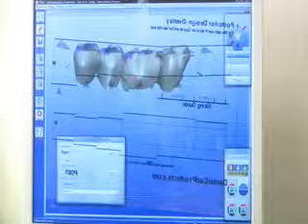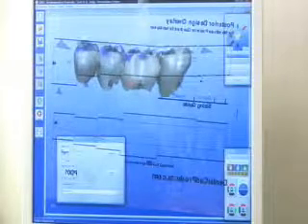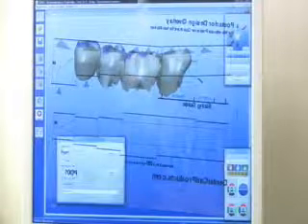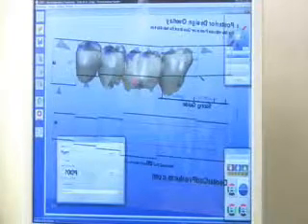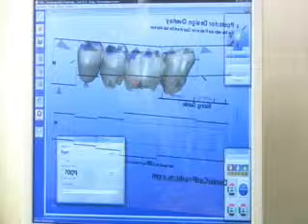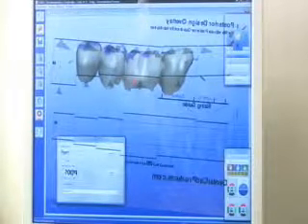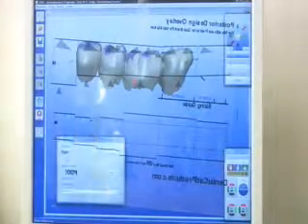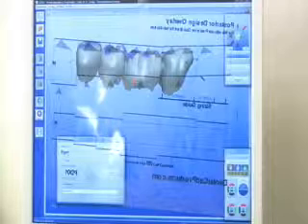The bridge function of the CEREC software is a great feature, allowing us to make provisional bridges. You couple this with the CEREC Connect software and you can truly do digital dentistry, having your lab fabricate the final restoration. It is a complicated feature though, and the overlay has been designed to help streamline the design process so that the dentist ends up with a better final provisional restoration.